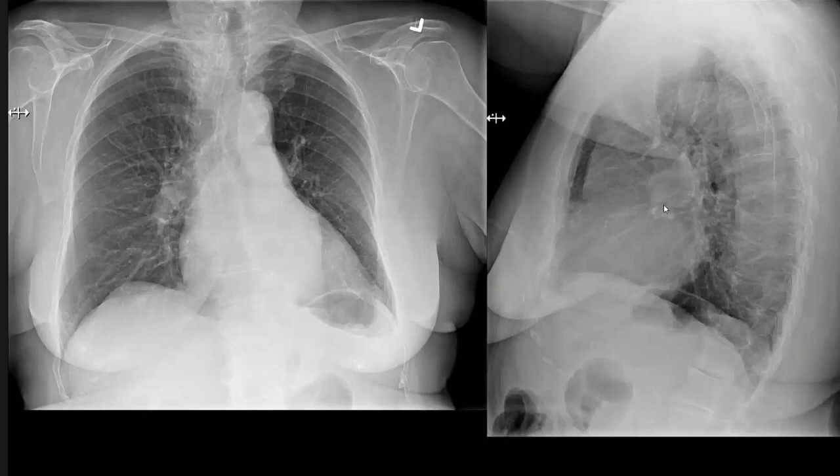So you're talking about this one, right? Yes, sir. So this is not this thing. This area is most likely over here in the infrahilar region. This is the hilar, and this is the hilar. So we're talking about an infrahilar lesion. So infrahilar would be approximately over here.